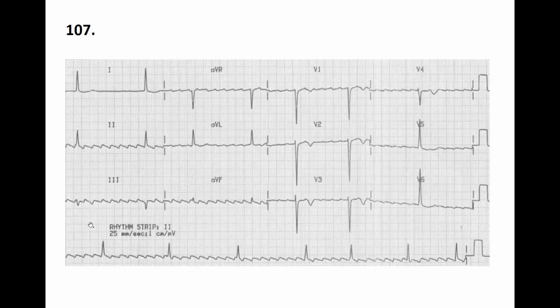Okay, if nobody has this kind of tracing, I would say these are the F waves, capital F waves. These are the flutter waves. So this is the atrial flutter.